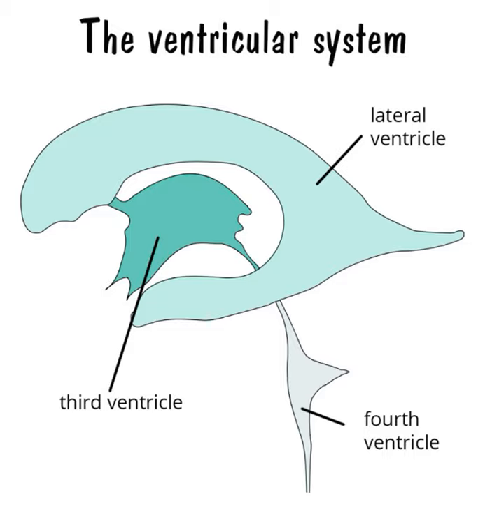Normally, across a shunt, for example in a third ventriculostomy, from the third ventricle towards the suprasellar cistern, you should be able to demonstrate a T2 flow void. In the absence of a T2 flow void, it would suggest that there is a shunt failure. Of course, there is always the possibility of shunt infection, which can begin with ventriculitis, lead on to cerebritis and fatal brain injury.